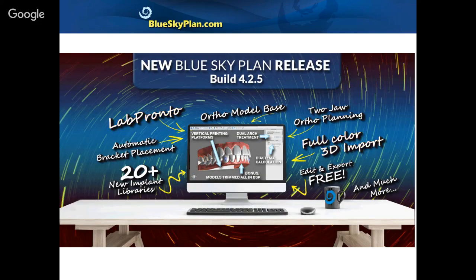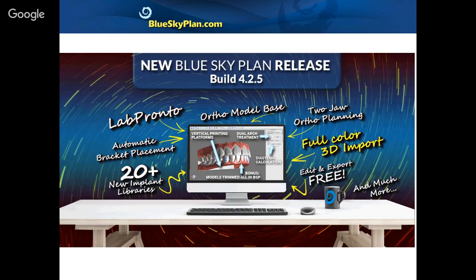And we've released a new version of Blue Sky Plan around 2 weeks ago. Just to touch on some of the new features and functionalities, the Ortho module is completely built into Blue Sky Plan with 2 jaw planning functionality. Continuing in Ortho, you have the ability to add a base for vertical printing. You have automatic bracket placement, and you're able to attach buttons. Everything can be exported. Currently, everything has been and continues to be free to export from the Ortho module.